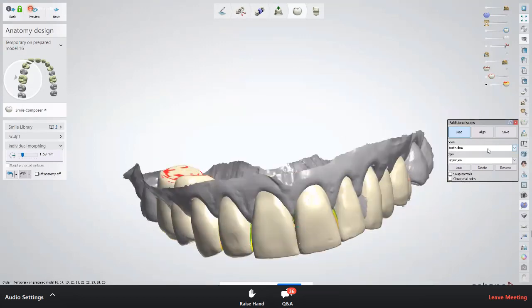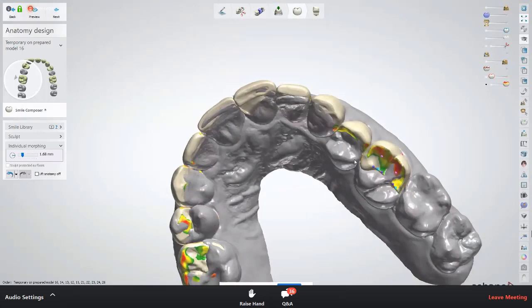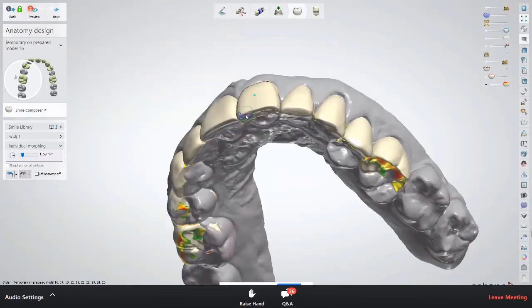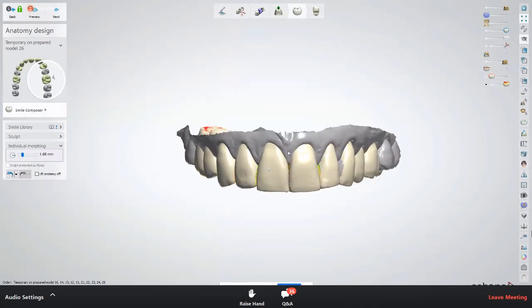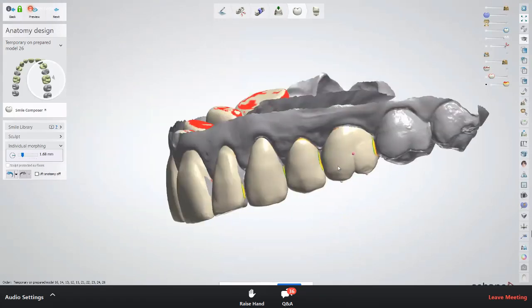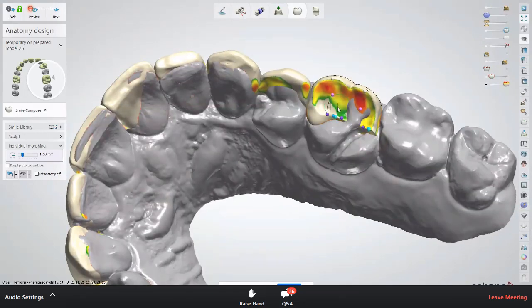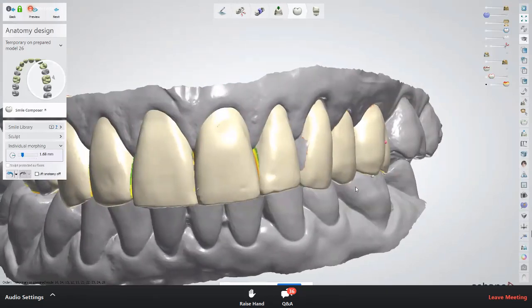So there's another one. Can you reduce the facial of number 14? It was very quick to get it. It seems like someone didn't get it. How did you reduce it on the facial of 14? Which is 14? It's like 8, 9, 10. This one? No? Looks like it. Hold on, I'm not so good. It's probably number 8, right? 9, 10, 11, 12, 13. I don't have 14 teeth. This is probably 14. Is this 14? That's going to be a great question to follow up on, but let me put another one in between.